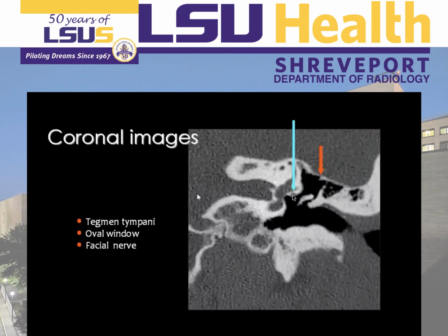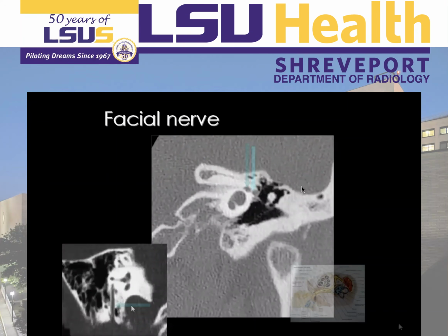Again, the facial nerve passing under the semicircular canal and going to the stylomastoid foramen.